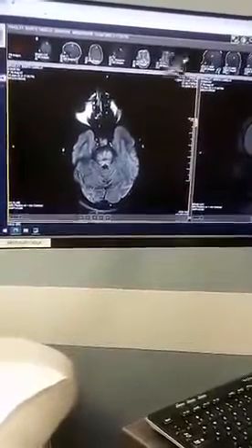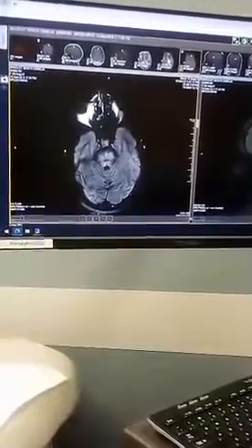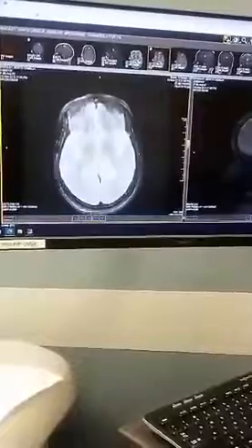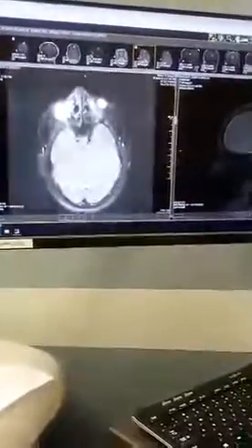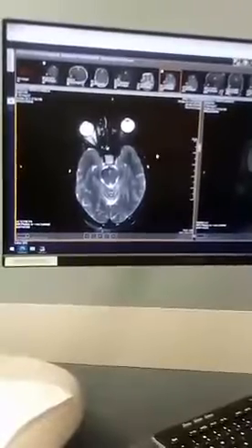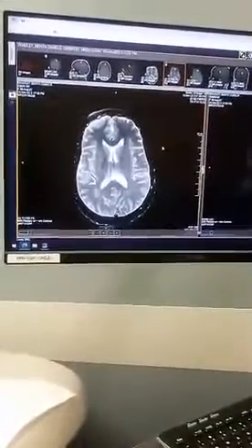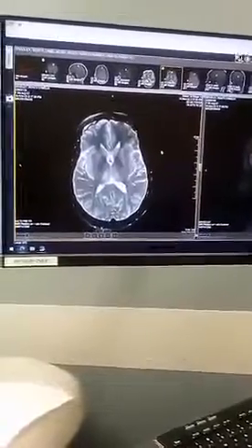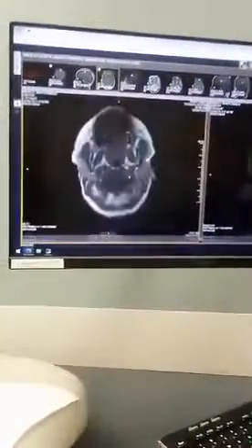Let me see. That was the FLAIR. T2. Let's take a look at these. Those my eyeballs? Those are your eyeballs. Oh my goodness. Or as I like to say, the Halloween costume. Let me see here.